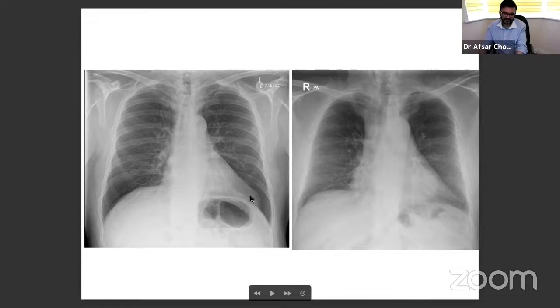Yeah, it's just something which is lucent, and fat will be lucent like this, like the subcutaneous fat you see here, and you can see vessels, every structure behind that, and it won't merge with the heart. You can still see a cardiac margin. If that's a pneumonia sitting there, usually they will have the same density as the heart, and that will silhouette the heart margin. So you can see the nice heart margin separately, and look at the previous X-rays; it will be there if you've got a previous X-ray. In rare cases, sometimes you may have to do a CT to confirm if it's not very typical, but most of the cases it can be cleared on an X-ray. Yeah. Okay. Excellent. Let's move on.